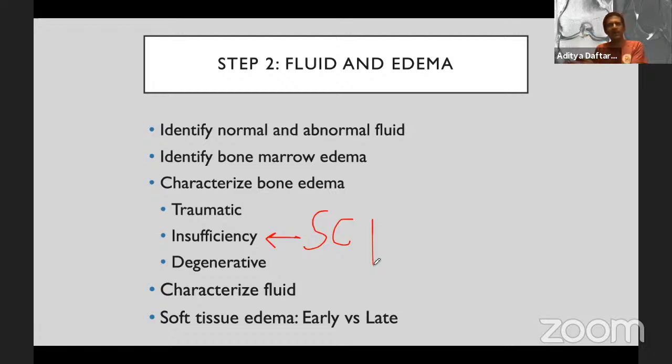And you've got this MRI that says everything looks continuous. And you say, you guys are nuts, there's posterolateral instability. And that's because that structure has healed, but it's healed in a lax way. So clinically, you're seeing laxity, but on MR, the structure looks continuous.